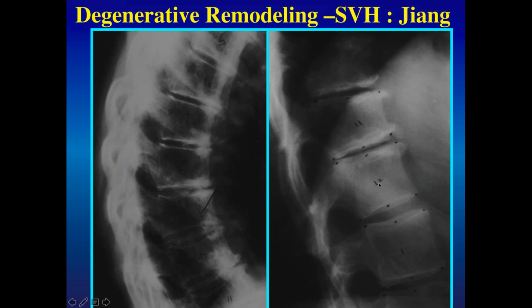Also, you can look at this and see that this is a heavily boned person. Regardless of the radiographic technique, you can see that these are relatively dense vertebrae, of course, denser than the adjacent soft tissues.